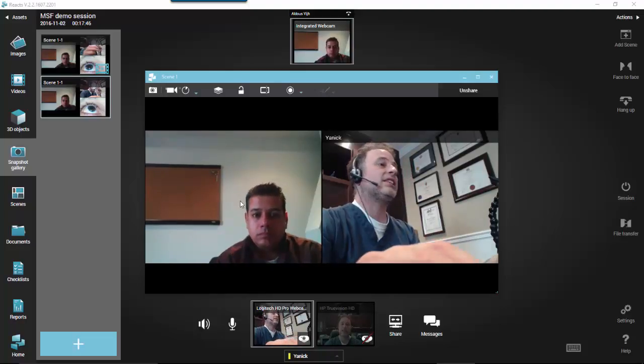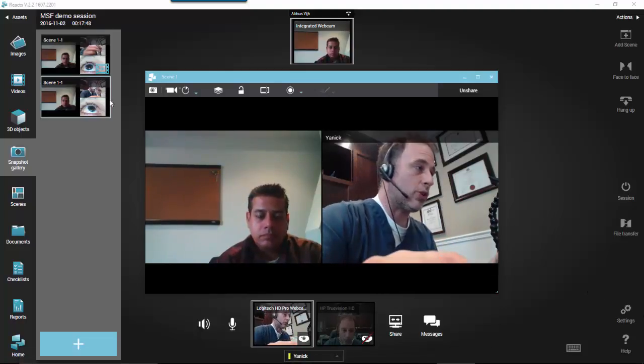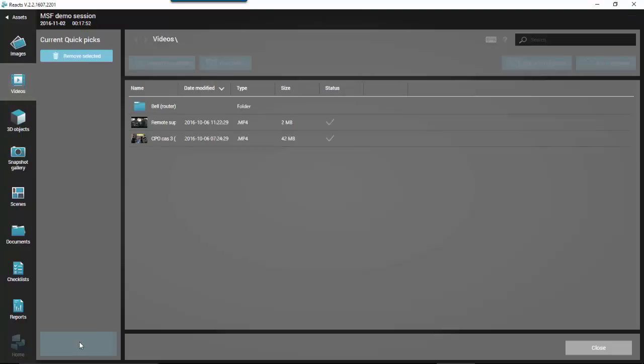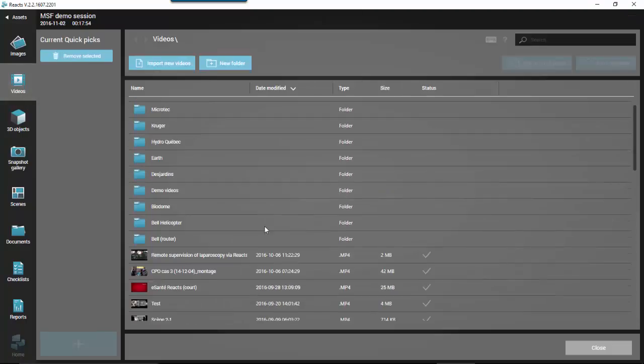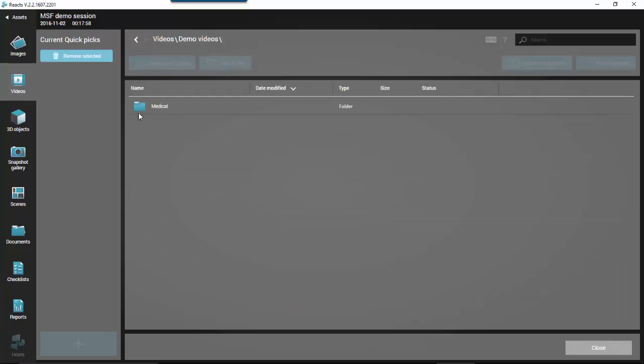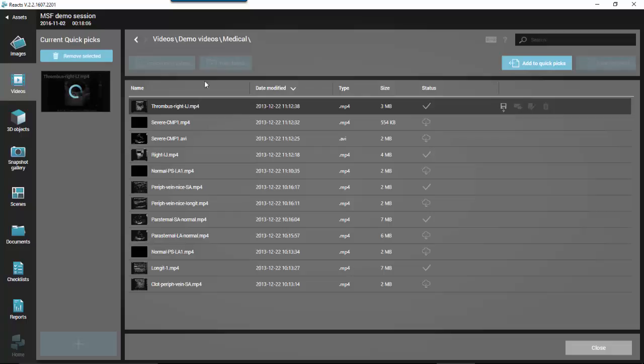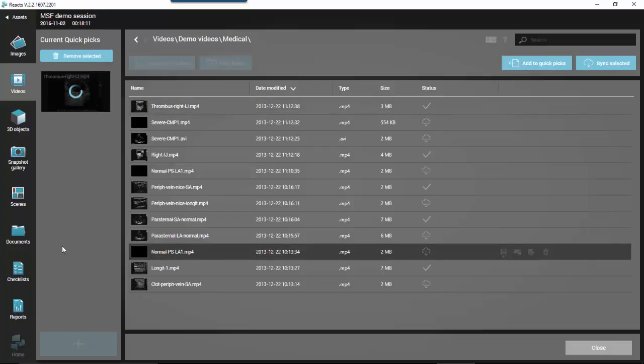Now, let's say I want to show him a video because I'm doing some recording or some teaching. So I'm going to go to video, into my video files. Let's say I'm going to get an ultrasound video. I'm going to go into my folder medical, and here I have a thrombus in the right internal jugular vein. I'm going to drag and drop it here. And I'm also going to get a parasternal long axis view of the heart. So I'm getting these two clips.